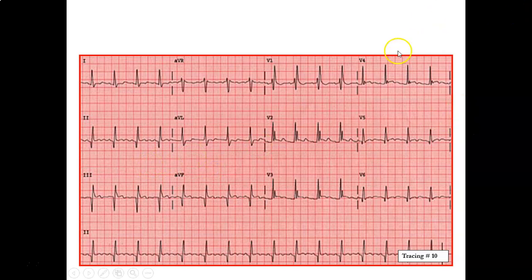Look at this ECG and just focus on the ST segment elevations. No ST segment elevation. Now look at the ST segment depression or abnormal T waves. No. Now look at the Q waves. Yes, they are seen in leads 2, 3 and AVF, and they are significant because they are more than 1/3 of the height of the R wave.